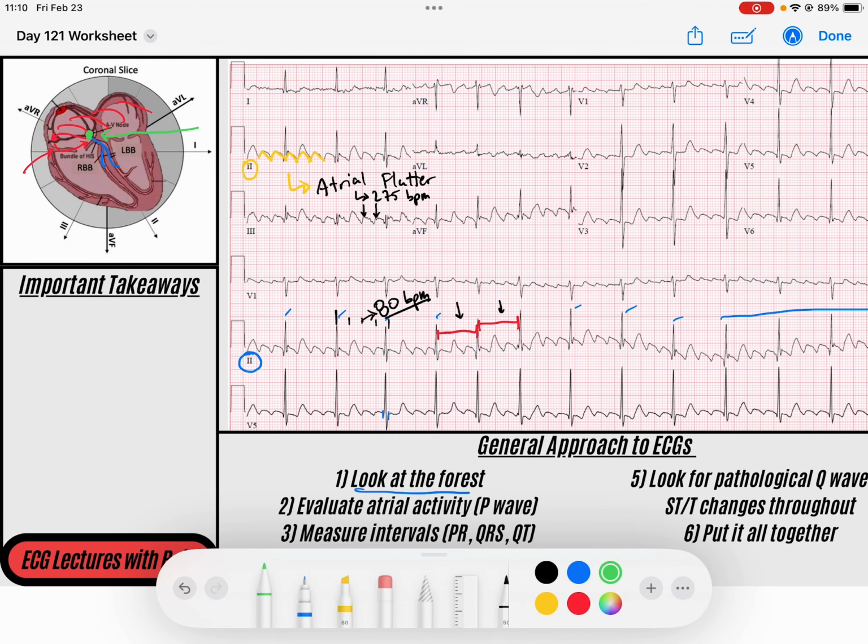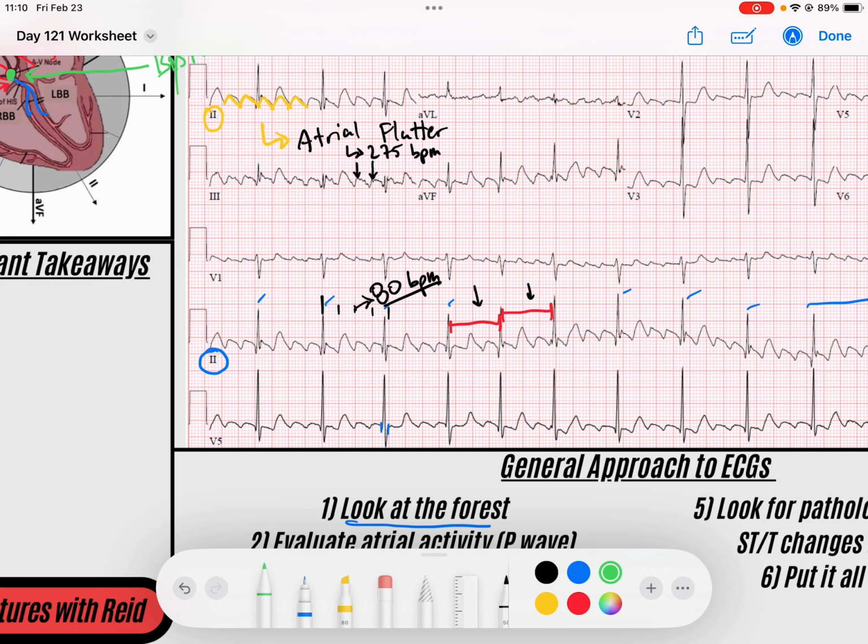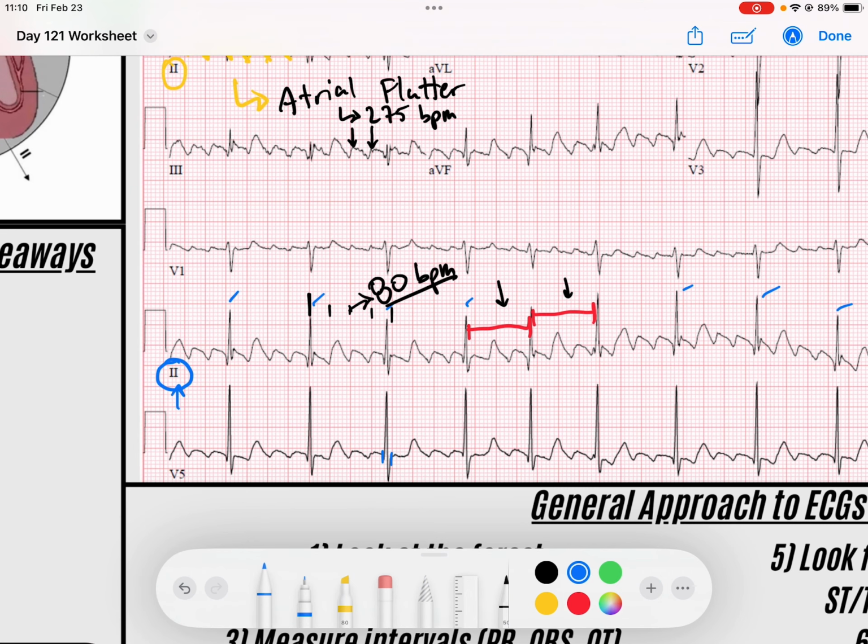So we need to determine how this bystander AV node is behaving. I feel like bystander is spelled with a Y. Well, we need to determine what the ventricular response is. How many P waves occur before each QRS, or in between each QRS? Let's march these out, right? We could use lead 2 again. I'm going to start from this one. So we have 1, 2, 3, 4.